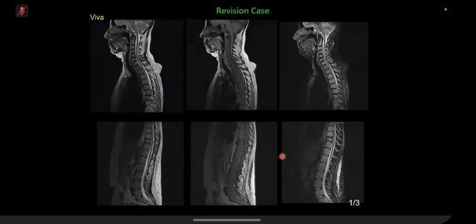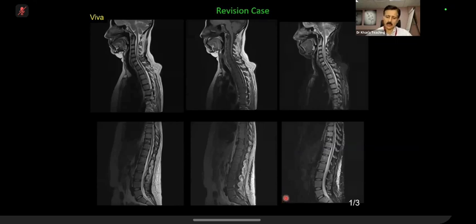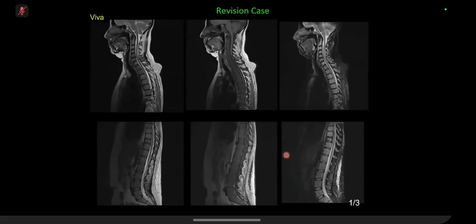So on the T1 weighted sequence, I think this is a relatively middle-aged person. There's significant loss of T1 signal, and there's fairly high T2 signal. So I wonder if this patient has got a global pathology, for example, significant infiltration of the marrow. So which sequence? You said that there is high signal on T2. What do you mean? On T2, this one or this STIR? Sorry, I meant the STIR, yeah. And there's no signal on T1.